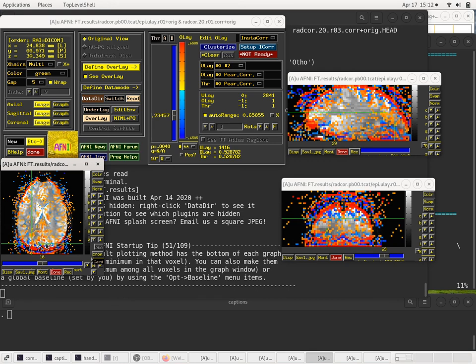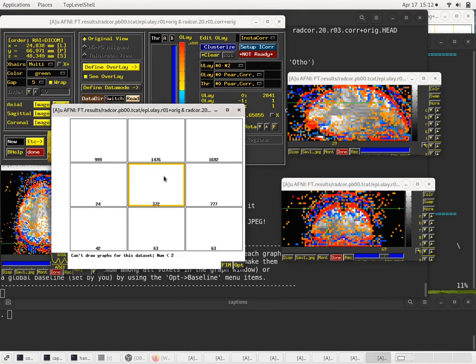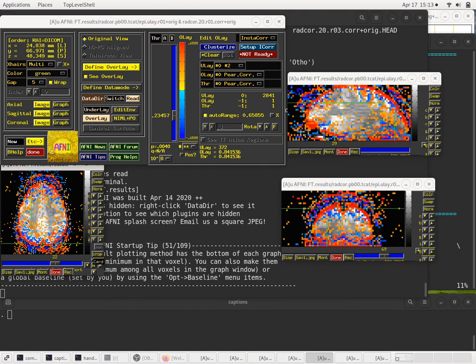So it's okay to see structural correlations. You expect a voxel to be correlated with its neighbors, but you don't want to see big blobs that are certainly non-structural. That would be bad. You see a lot of motion correlations here, like up here, this has got to be a motion correlation pattern. We can't really look at a graph. We only get one value again because our underlay is just a single EPI volume. But anyway, there you go.